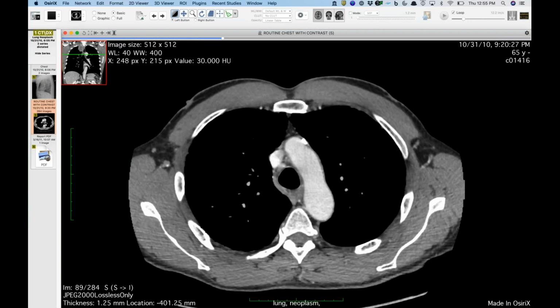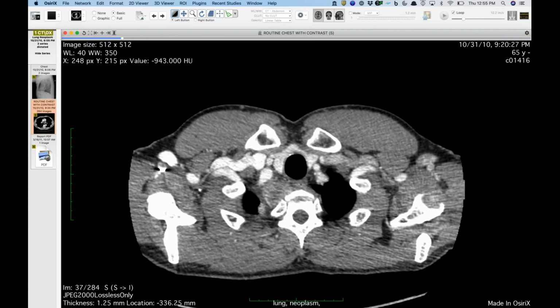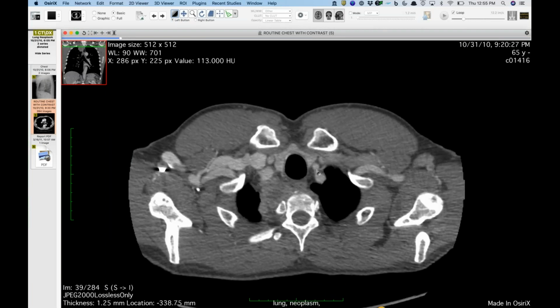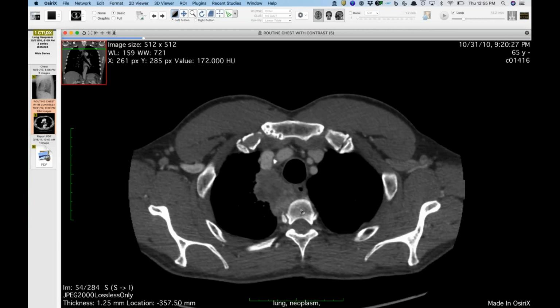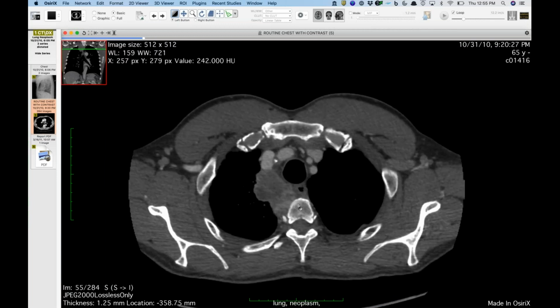And the rib was intact, right? Just what's that? The rib was intact. The rib? Oh, it doesn't really involve the ribs. It's more just adjacent to the vertebra. Yeah, it might actually invade the vertebral body right there. Oh, it kind of looks like it encroaches on it.